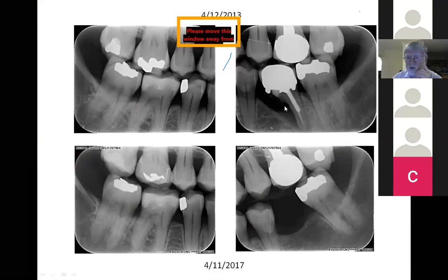So going back to the previous x-ray where we had that one patient, there was a lot of resorption. It was a 4.6 in that case, many slides back. And I said to you, if you wanted to do some silly heroics, you could remove that root and do a root filling on the distal root of that 4.6 and try to get that tooth sitting on the one root, which is what somebody's done here.